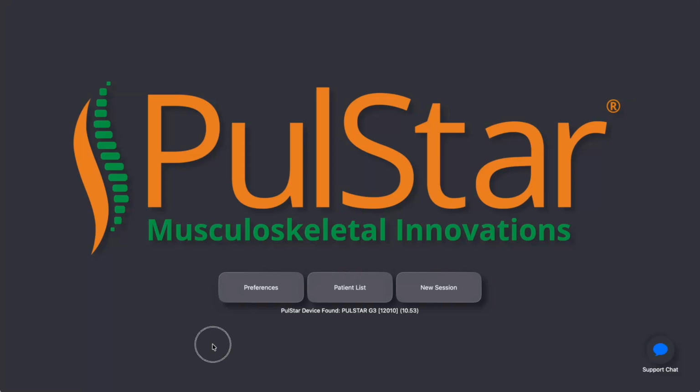PulStar version 11.0.51 is here, and it's packed with updates that save you time in the exam room, protect your subscription, and give you finer control over every adjustment. Let's take a look at what's new.